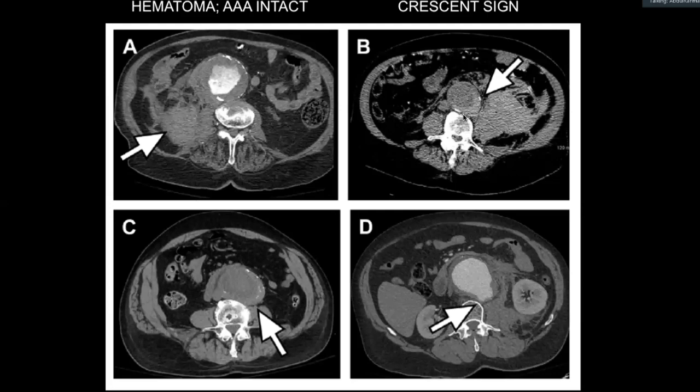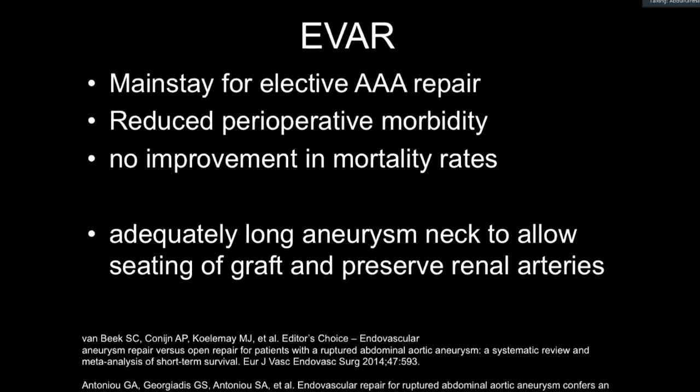Now, this is very important in elderly patients who present with renal colic. Beware of the elderly patient with renal colic who ends up having a CT KUB. Bear in mind that they could have early signs of a ruptured abdominal aortic aneurysm. So high density on a non-contrast CT is indicative of this. Obviously, a retroperitoneal hematoma is consistent with ruptured aneurysm. And obviously, frank disruption is something that, well, this is probably the easiest sign of them all.